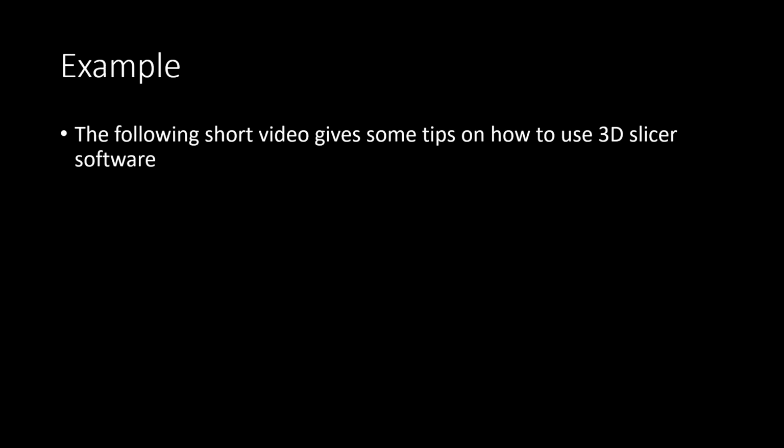I'm just going to give you a short example as well that has a couple of tips on how to use the 3D Slicer software. I'll be the first to admit that I'm not an expert on this software. I'm using Romexis from Planmeca, and that I use for most of my data sets, but I have figured out the 3D Slicer software a little bit. So just an example of one case and a couple of functions that I found that might be helpful for you to evaluate these cases.